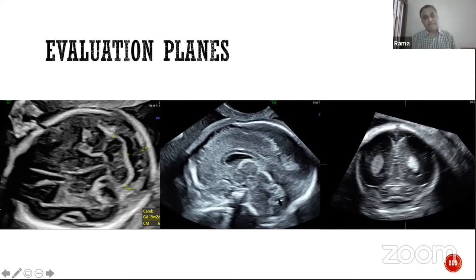Now, it's a classical kidney bean appearance. The hilum of the kidney bean is actually the highest point of the fourth ventricle, and we call this the fastigium. The upper portion of the kidney bean is a little narrower than the lower portion. The upper 1/3 versus the lower 2/3 is marked by the primary fissure, which you see as a small little indentation if you zoom this image.